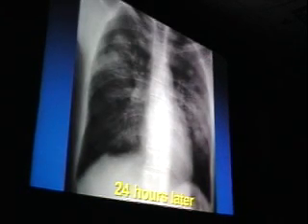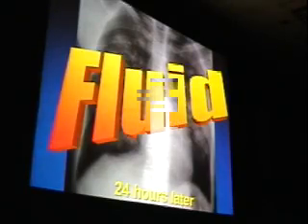But when I show you a film taken 24 hours later, this is edema. Just about nothing else within the lung is going to clear, or nearly completely clear, I should say, this rapidly. That pretty much narrows it down to edema. Now, we really don't have time, and I don't want to bore you with the differentiation of cardiogenic from non-cardiogenic edema. You should be able to apply general rules. Suffice it to say, this is a form of permeability or non-cardiogenic edema.